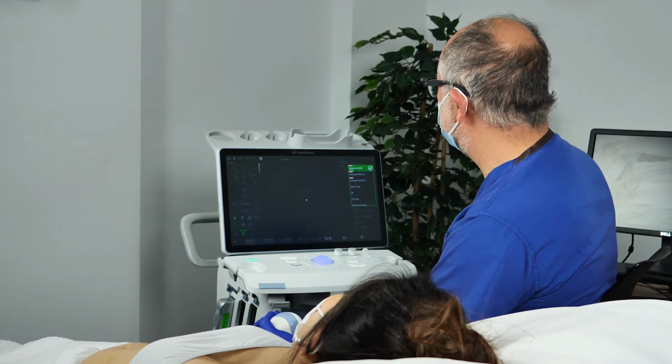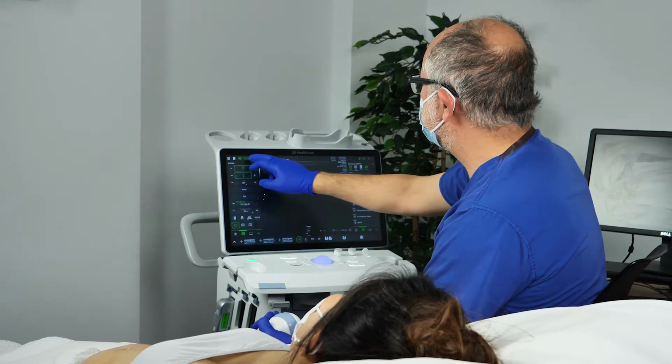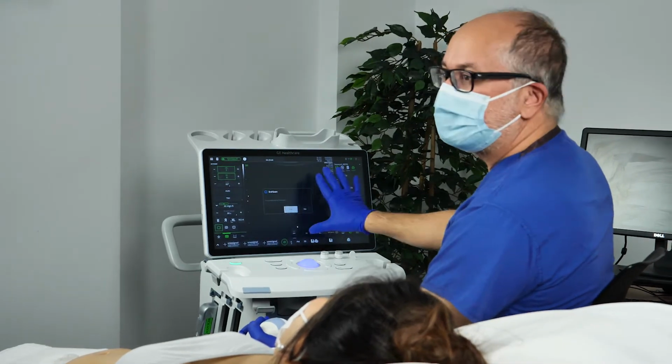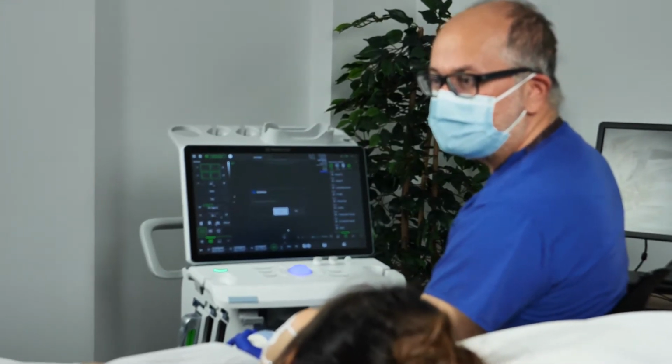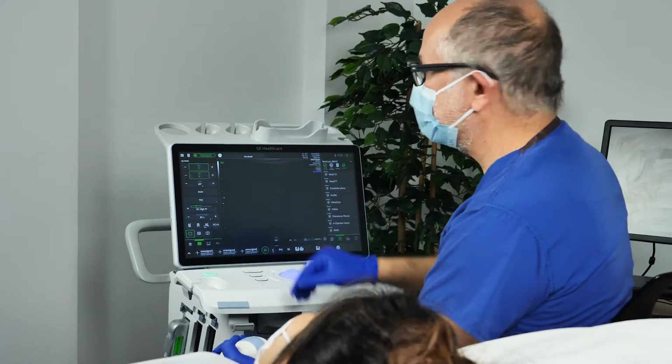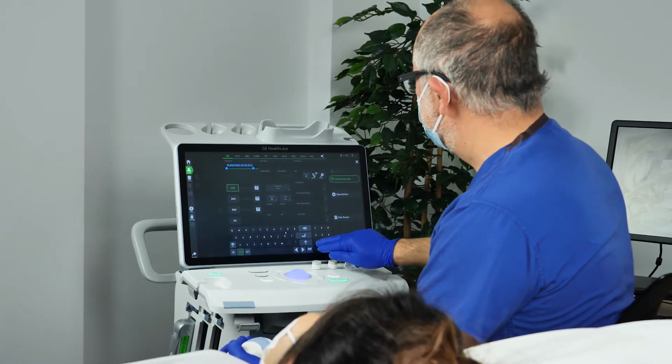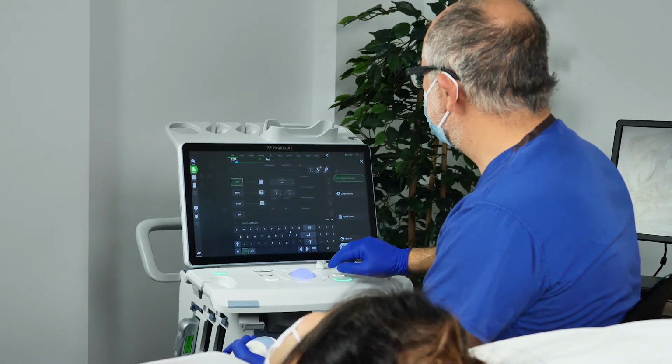So when I click here now, what you can see is that I've completed my examination, and when I click End Exam, as opposed to before, when it came up with that screen that said, hold on, there's some red bits here, it's now allowing me to end the examination, and then it's done.